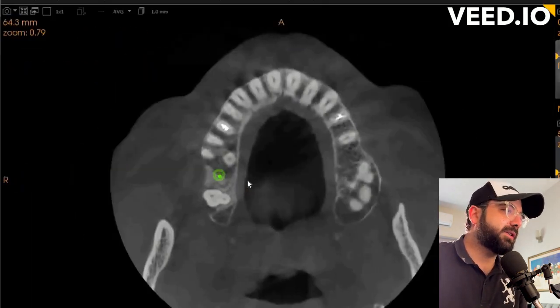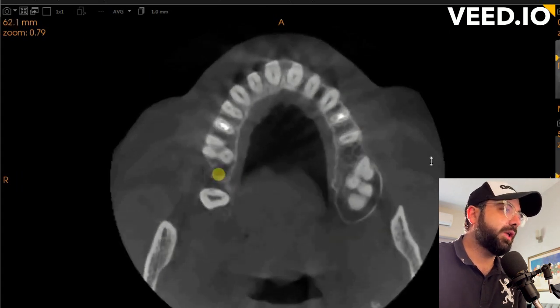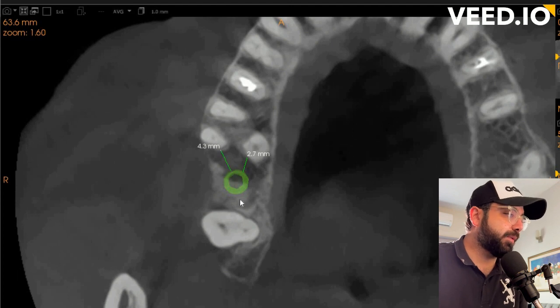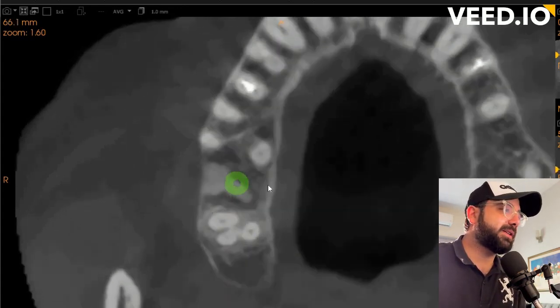that the implant is placed in the center of the ridge and does not invade any natural tooth structure. So here you can see the green part is where the implant collar is, and we're going to zoom in, and there we go. Here the most important thing is the interdental distance of the implant and the mesial root of the 6. We don't invade any natural structures, and on the distal aspect is the 8. We also don't invade any natural structure. So you can see the implant is placed quite in the center of the ridge.